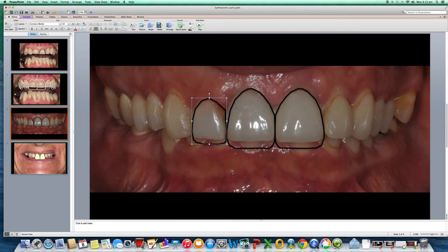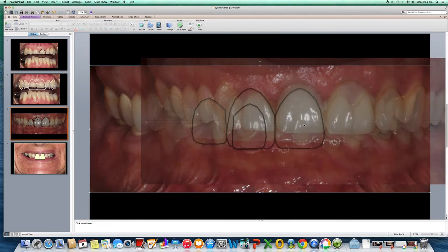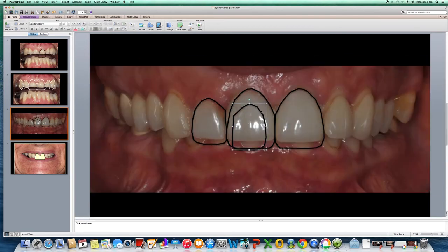So there's a lateral, duplicate. It's 2.6. Bit squarish there, but you get the idea. So it looks like these laterals are a bit fat, so we can just shrink them down. 2.4. You can also pay thousands of dollars for software that does this.